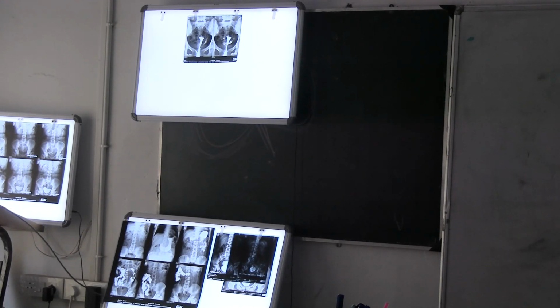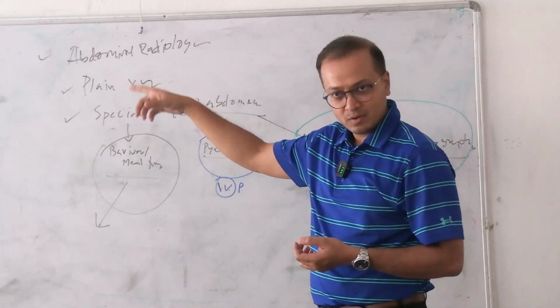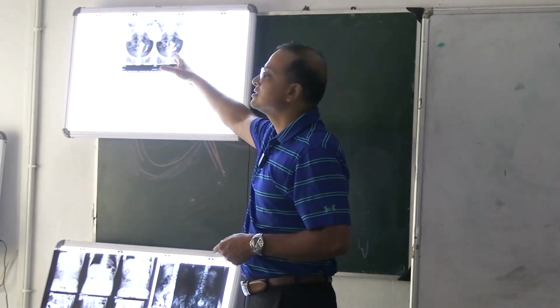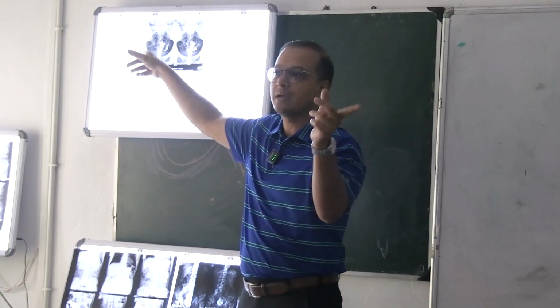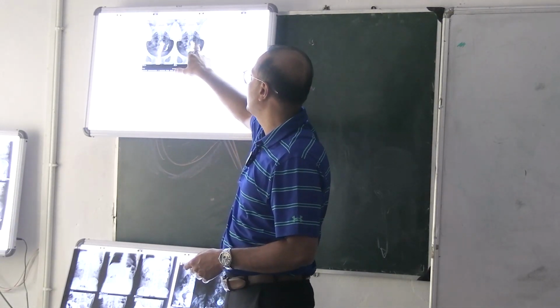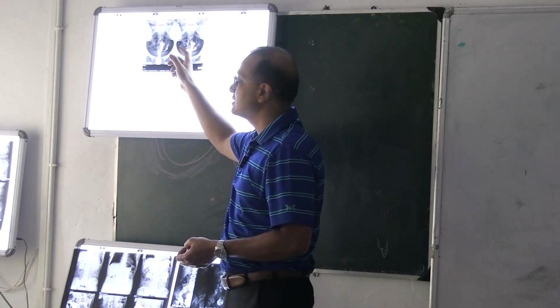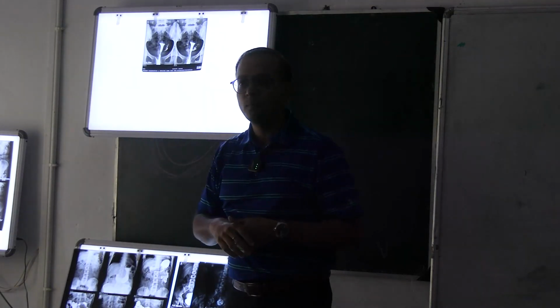Obstruction. Likely the tube is blocked. That's why the dye is not passing through. On this side the dye is coming out; on this side the dye is not coming out. So likely there may be a blockage. Why are we going to visualize this tract? Because we are going to see if the dye is put through, whether it goes to the tubes, to the salpingo tubes, and eventually spills over or not. If it is spilling out, we call it a spillage of the dye, coming out through this particular tube. The faint fallopian tube is seen, and we can see the dye settling down here. On this side we cannot see anything coming out, and even if it is coming, compared with the other side it is less or very less. So there is a good chance of blockage on this side, while the other side is open.